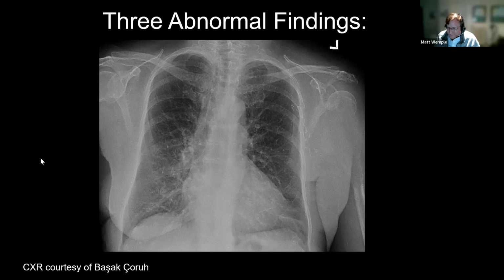Okay, so starting with airway here, it looks a little bit deviated. That's actually not that big of an abnormality, I think, compared to some of the others. If you go to bones and soft tissue, right here, this is abnormal, right? You should basically be able to see the shoulder look pretty normal. Yeah, there's definitely something going on with the shoulder. There might be a dislocation as well, but I think that the loss of any bony mass here, or the spicula or the bone here, is abnormal.